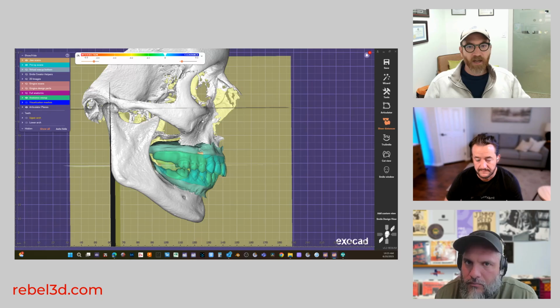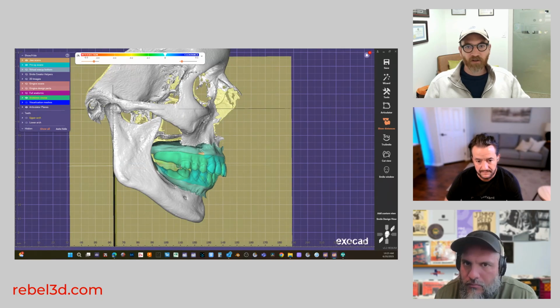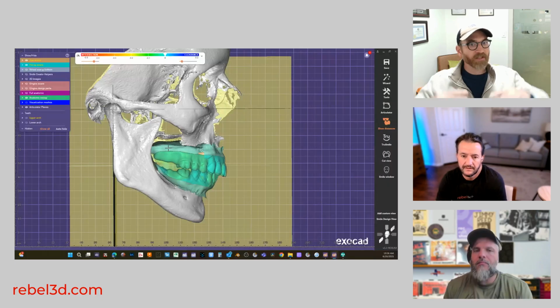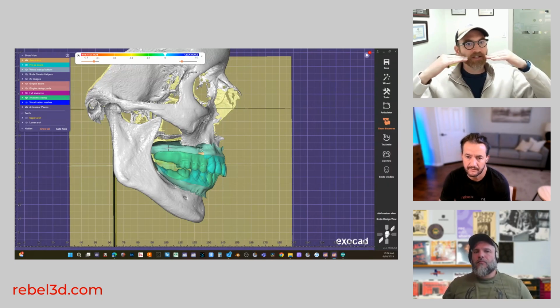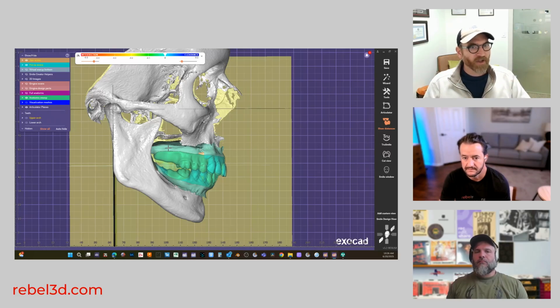Okay, and typically occlusal planes are going to have some sort of cant, and I bet you this is close to maybe 7 to 10 degrees off of that plane, and so that is normal. When you look at a face, you rarely see occlusal planes that are flat. Those are typically going to be artificial, and they're going to have a poorly made denture type of look.